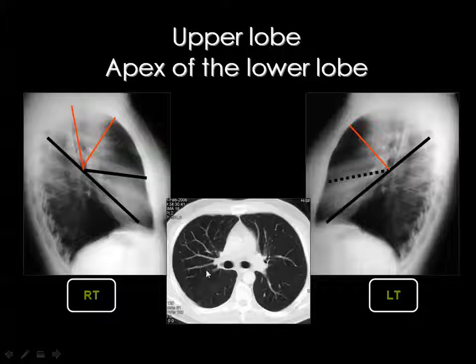And whenever the trachea bifurcates, then you get division of the section into two, like this. If you look here on the left side, this section is near the hilum. What is remaining from the upper lobe? It is the anterior segment and the superior segment of the lower lobe. And here, the anterior segment of the upper lobe, because the apical and the posterior are not yet present, and you see the superior segment of the lower lobe.